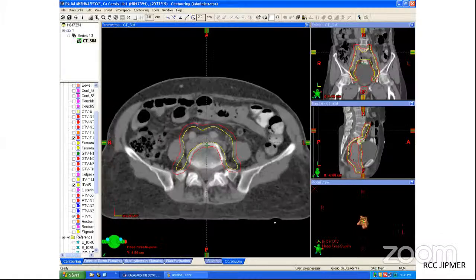Fine. So this image is actually the contours which are drawn in our institute, just to show you an actual picture of what is happening there. So as you can see, in this case, the lateral sleeves have been quite long. We are not supposed to have such long sleeves. As I described, 1.5 centimeter expansion on the aortic side of this posterior extension. On the IVC side, we will have to have only 6 millimeter expansion.